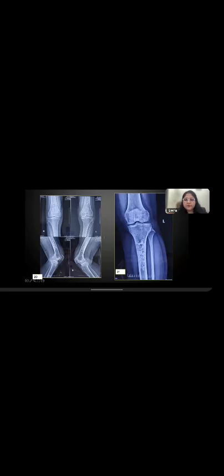Yes. So, 20, many people have said enchondroma, 21 also. But this is what I was talking about, ring and arc type of calcification. However, such large enchondromas in long bones are very difficult to find.